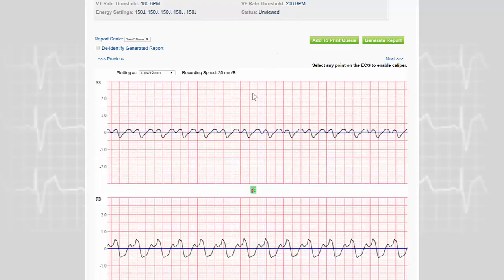beats per minute. And a few days after the patient went home, he developed a typical atrial flutter. And you can see here the detection of an arrhythmia by the device. And you can see here the typical aspects of the atrial flutter.